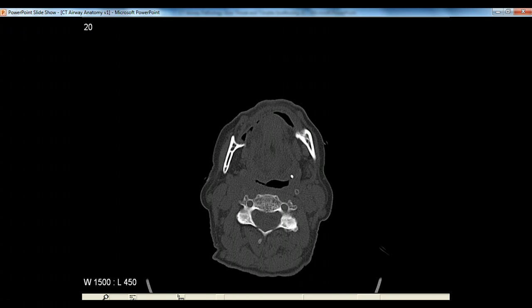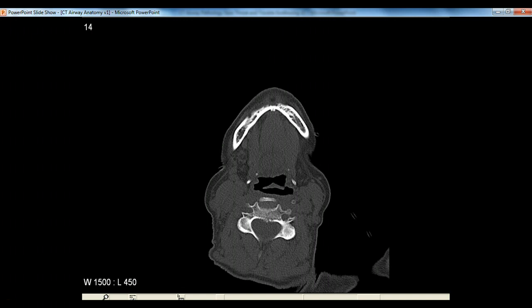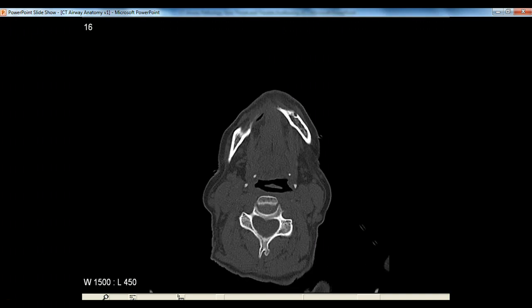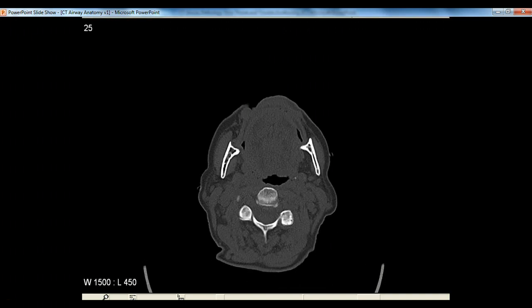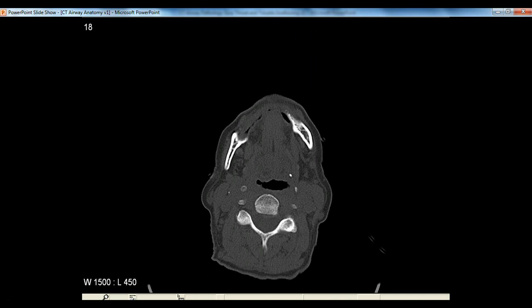So we're still seeing the tongue. We're seeing a little air under the tongue there, just like you have air under your tongue if you lift it up. And there's the jaw. It's coming forward. So let's move back again there. Tongue, air, jaw coming forward.